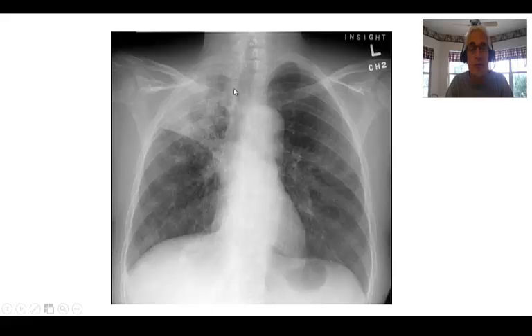This patient has pneumonia. Has tuberculosis in the right upper lobe. What proved that? Well, of course, the AFB sputum proved that. Tuberculosis loves the apices, or the tips of the lung, where there's the most oxygen. TB loves high oxygen concentrated areas.